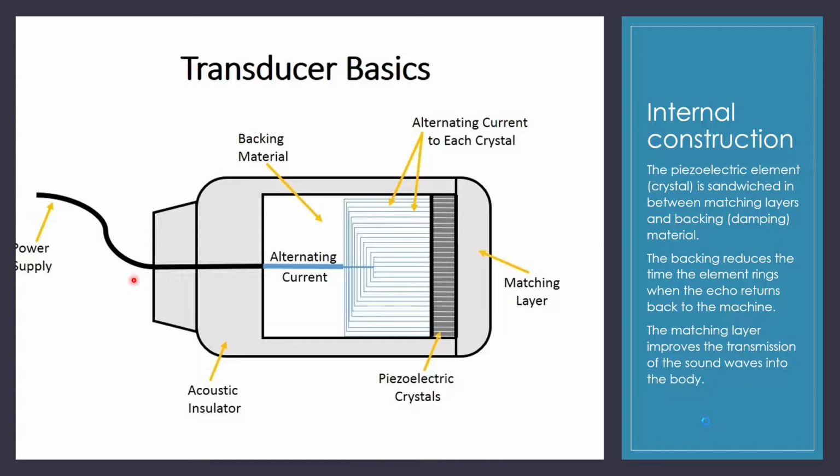So it's really important to pay attention to the transducer face, which is what actually touches the patient, to make sure there are no cracks in the housing and no showing of the crystals, because that electrical current can shock the patient. So we always look at our probe to make sure there are no cracks on the front, and also that there's no frayed wire coming from the machine to our probe. And that's something that when we do our quality assurance testing, whether it's quarterly or biannual, we will always assure that that's intact.